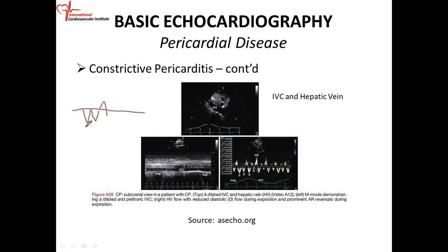So this is your systolic component. This is your diastolic component. And your atrial reversal. Okay? This is the normal hepatic vein flow. Systolic, diastolic, atrial reversal.